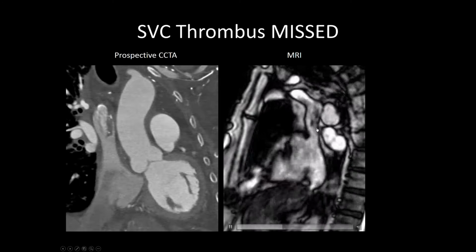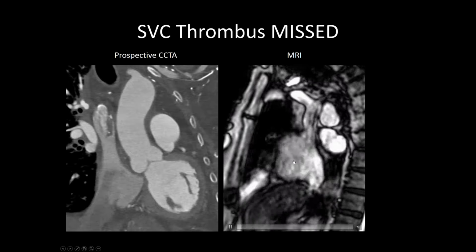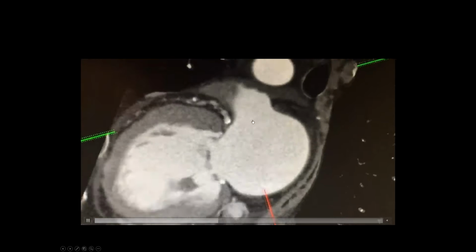The MRI itself did not show a clear image. I'll go through these images again in the slide to show you some of the videos that we have. I'm going to try and see if I can play them on a different computer. But you see again, it wasn't clear whether there was anything there. So that's why it was sort of missed. And I just have these images just to show you again.